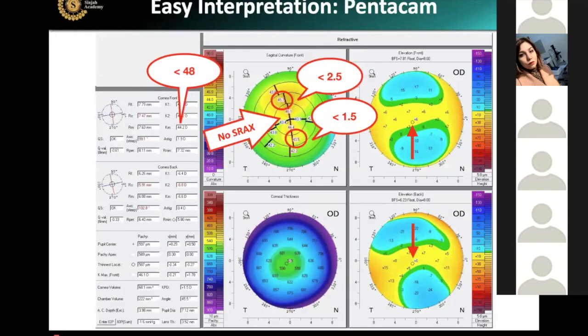Now we come to the other point, which is the corresponding point.